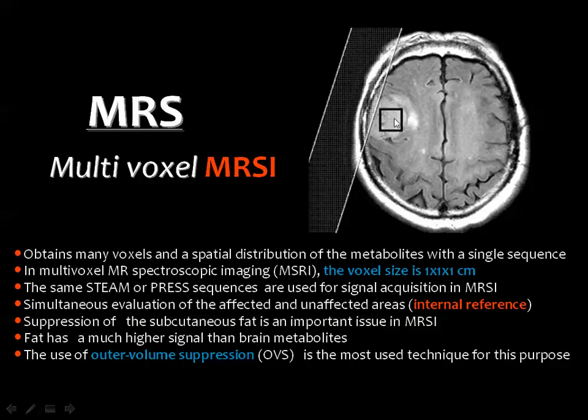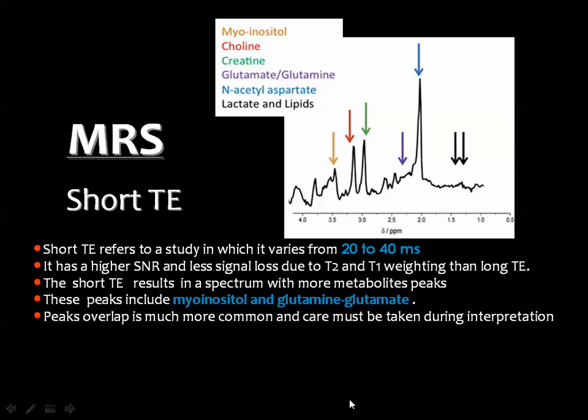If the lesion is very near to the calvarium, the diploic fat or the CSF, these structures will disturb the spectrum. So we should have some sort of suppression of the fat and the fluids in order to obtain a smooth, high resolution spectrum.